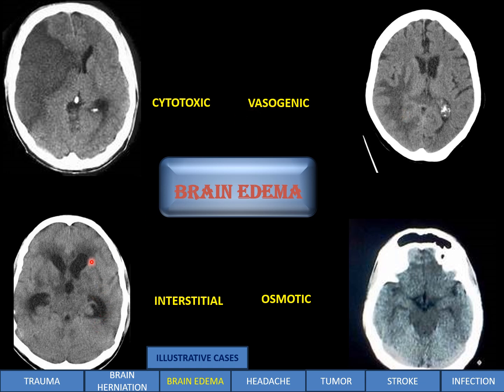In interstitial edema, the place we look for is the periventricular aspect of the frontal horns and the temporal horns. It leads to a blurry, fuzzy kind of appearance. There is a rounding of the frontal horns and rounding of the temporal horns. All this is suggestive of an interstitial edema, which basically means that this hydrocephalus or dilatation of the lateral ventricles is acute in onset rather than a chronic etiology.